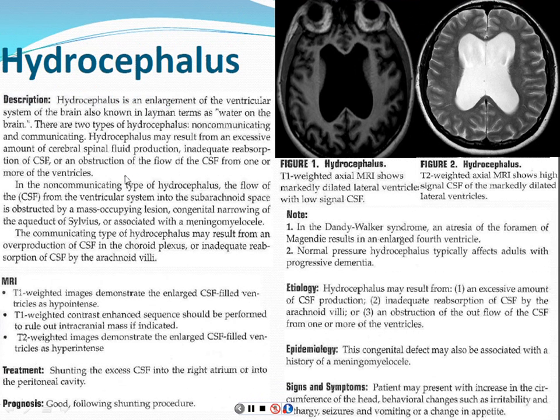This is just hydrocephalus. It's a general term for enlarged ventricles. This can be caused by obstruction of the ventricles, like I've talked about with certain tumors, or it can be caused by overproduction of the fluid, the CSF. In older patients you may see not really hydrocephalus per se, but enlargement of the ventricles, because you lose some brain volume with time, and so the ventricles may look larger.